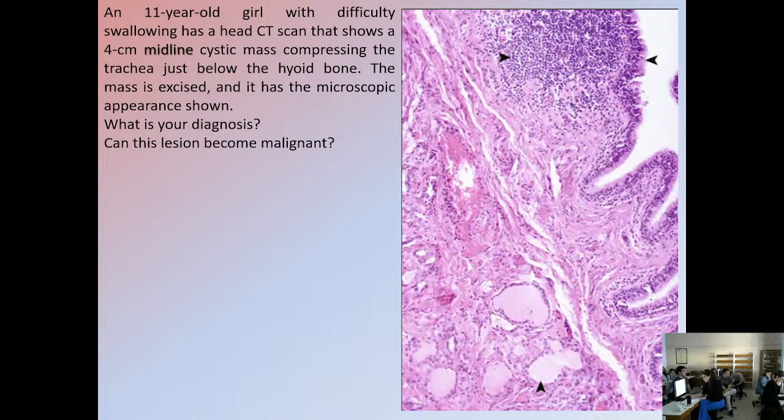However, there is one histologic finding that makes us understand the diagnosis, identify the cyst properly. And it's this tissue here. What sort of epithelium is this? And what does it form? Have a look here. These structures here. What sort of epithelial tissue is this? On the bottom, at the bottom. What can this be? Yes. What epithelium is this? Yes.